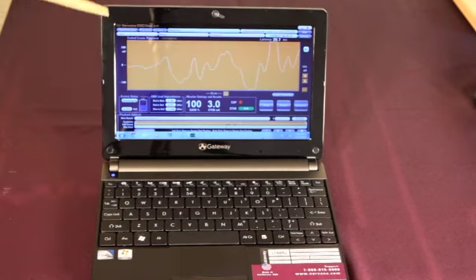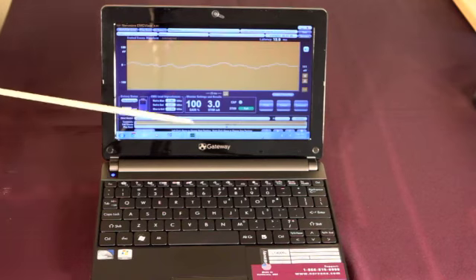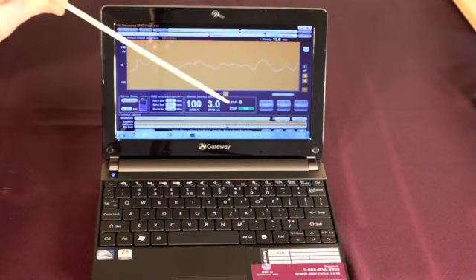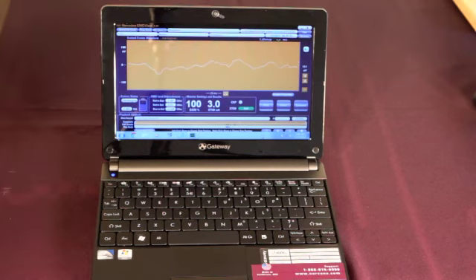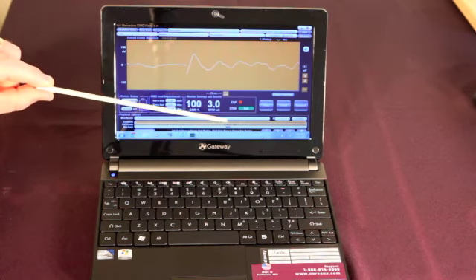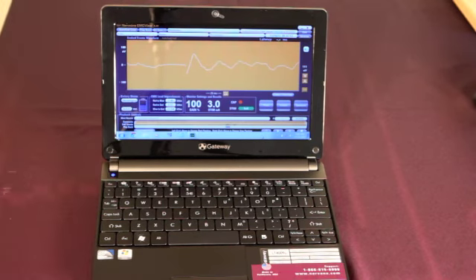Now going back down and clicking on the play button, you can see that now I'm getting data changing across my screen. This is part of my playback file. And you now note that the blue bar is advancing, my cap light's flashing, I see stimulation full. This is where something significant happened during the surgery. And now the blue bar has stopped advancing because it reached the red line. That's the end point that I moved up.